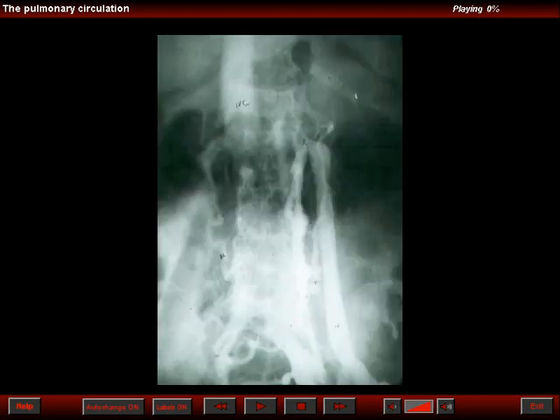This is a patient who had a successful ligation of the inferior vena cava distal to the entrance of the renal veins, and a few months later had recurrent pulmonary emboli. A study of the veins revealed patency of the inferior vena cava above the site of ligation, but note tremendously enlarged ascending lumbar veins and perivertebral venous plexus.